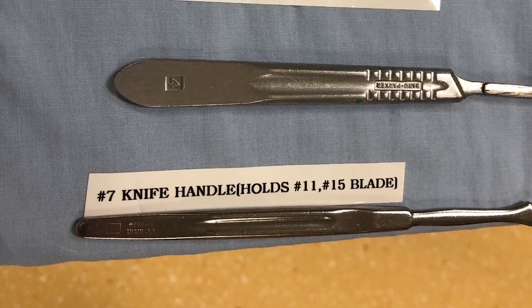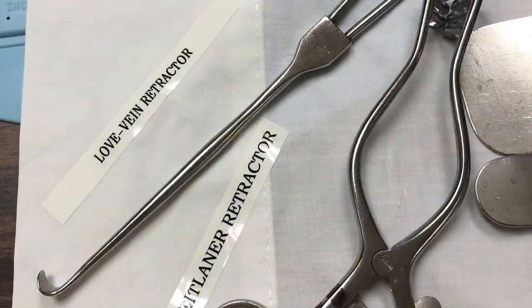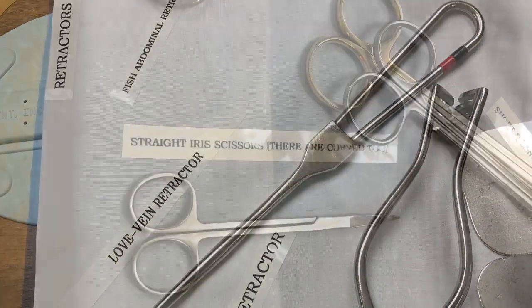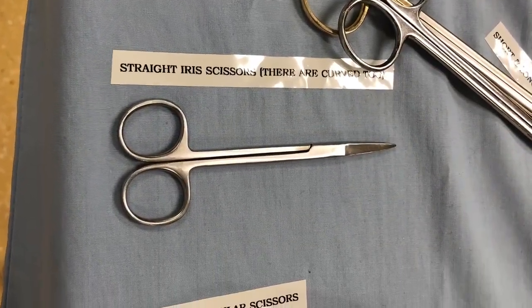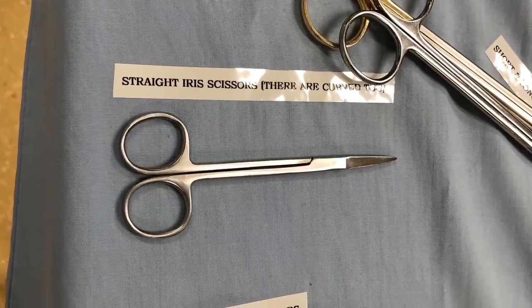The purpose of this video is to help you understand and identify instruments for this course that are also used for the majority of general cases. Names, categories, and instrument functions will be discussed. Remember to pass each instrument in the manner it will be used. Special care with blades and sharps.